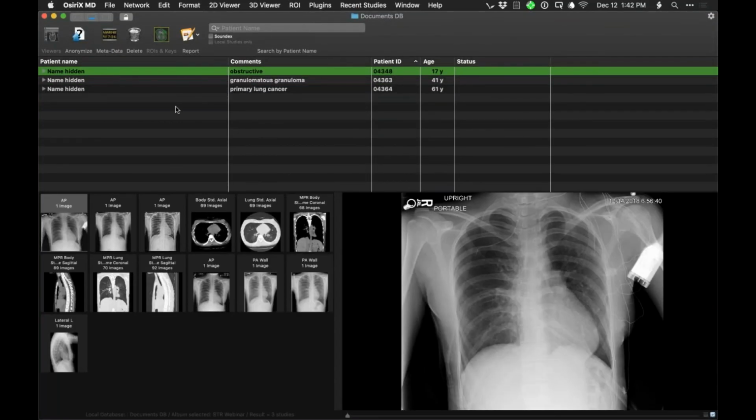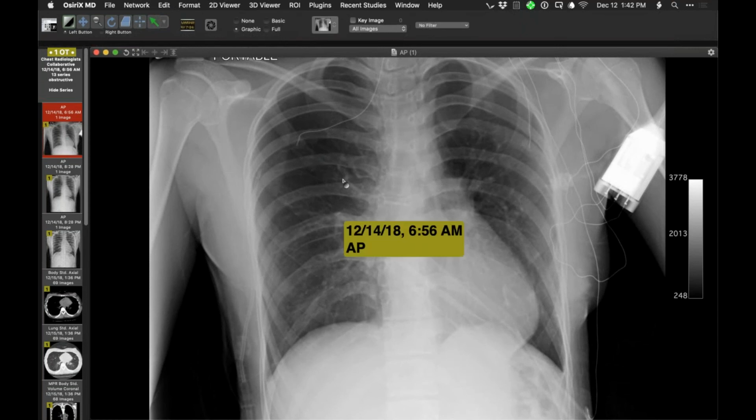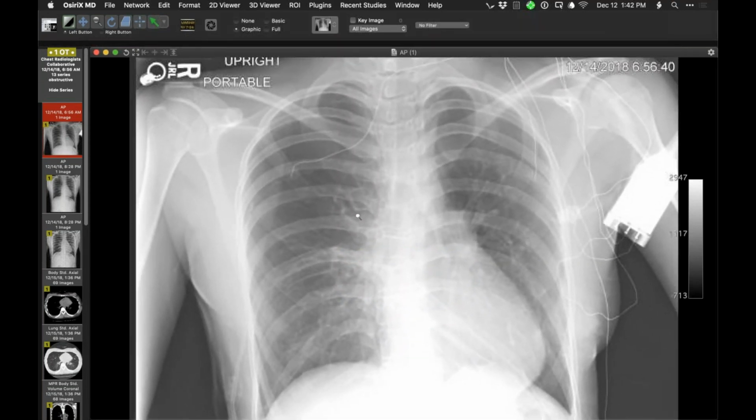All right, the last patient I'm going to show presented, I can't remember if she presented at another hospital, with a pneumothorax. A chest tube is now present, a catheter. So the lung is up. There is a very small amount of residual pleural air in the pleural space. So far we have a young person with an apparent primary spontaneous pneumothorax with expansion of the lung.